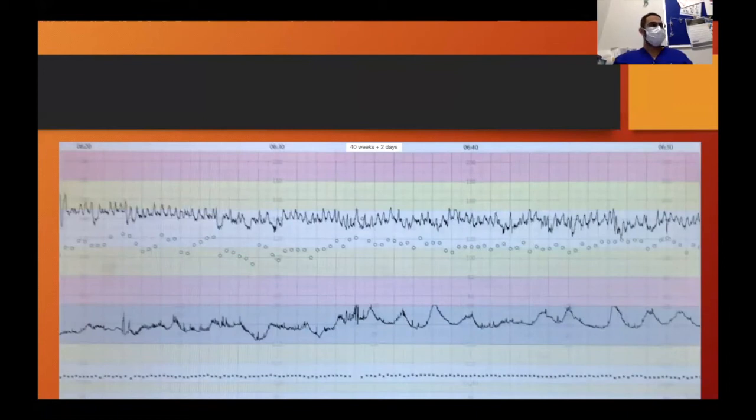Pseudosinusoidal. So the sharp parts are pseudosinusoidal. Okay. But we know that baby was responding fine. So that would make me think again, okay, well, pseudosinusoidal trace can happen when there's a bit of bleeding. There's no bleeding on assessments and on VE, or not when we made the assessment. Could there be a bit of bleeding behind? Okay. Can there be a bit of bleeding that's hidden inside?